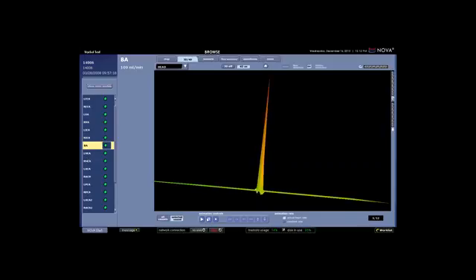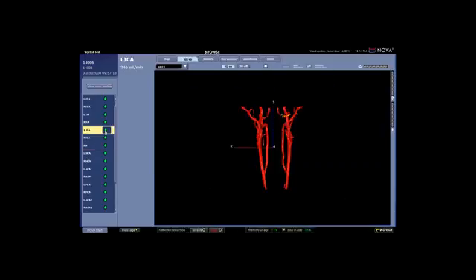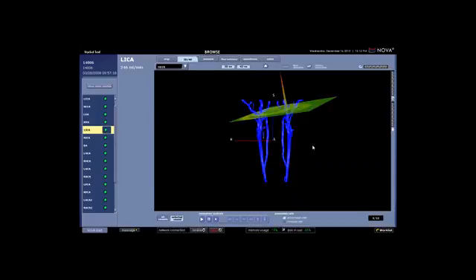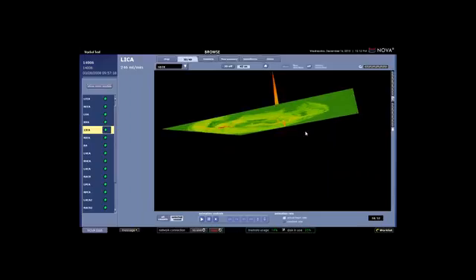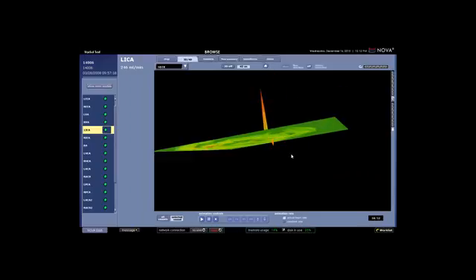Now that's the basilar artery. We can take a look at another example of 4D here. So here's the left internal carotid artery. I'm going to select just the carotid here, animate it, look at just the vessel. Now in this plane you can see we're actually showing the venous flow as well.